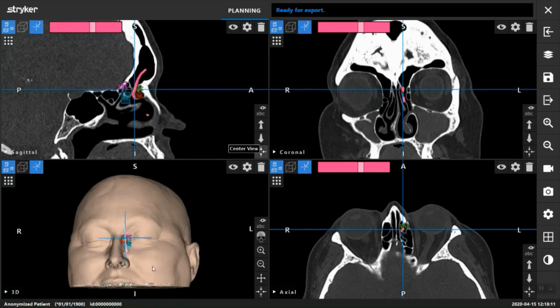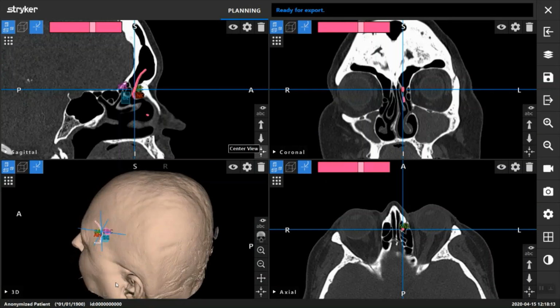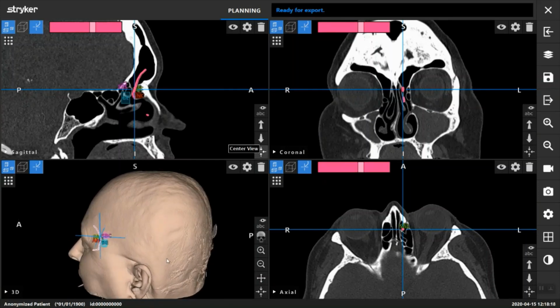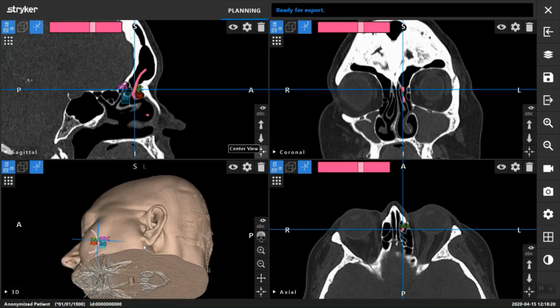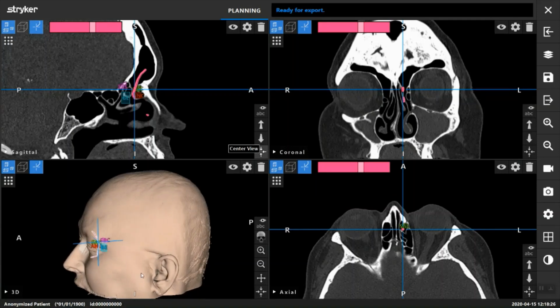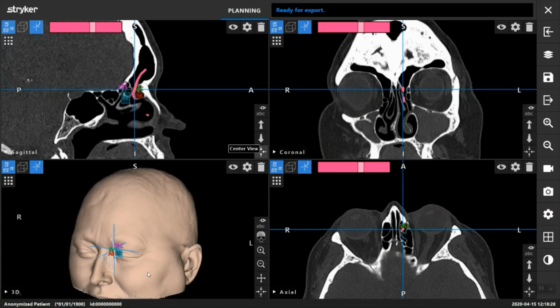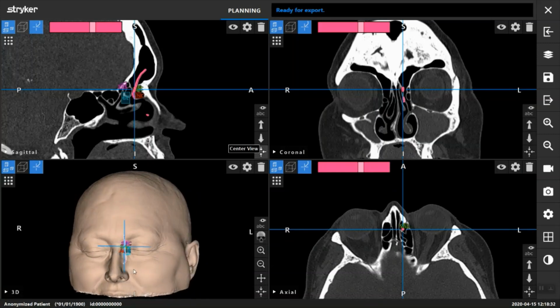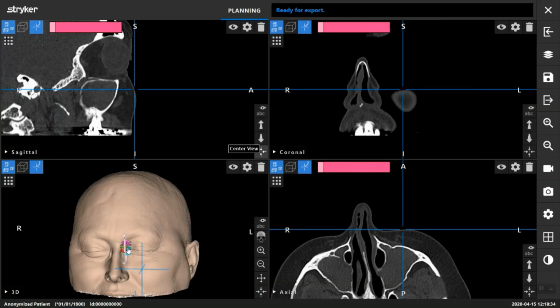If you come over to the 3D anatomy, you can spin this around however you choose. That gives us almost like a sagittal view. And you see the bulla, the suprabullar cell, agger, supraagger, and you can really get a good view of that. Here you see that we're going to be medial to those anterior cells.